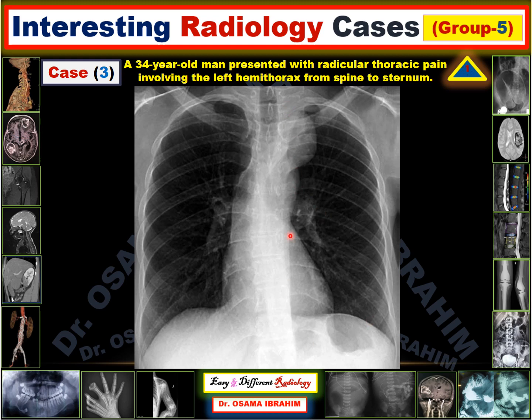If you look closely at the frontal chest radiograph, you can see the trachea appears central, and the heart border appears not enlarged, of average size compared with the thoracic width. The lung itself on the right side, comparing the upper, middle and lower zones, has no focal lesions or abnormal hyperlucency. The examined clavicles and ribs appear normal. The hilar regions on both sides are symmetrical and no hilar masses are detected, no pleural effusions, the costophrenic angles appear normal, and no pneumothorax.